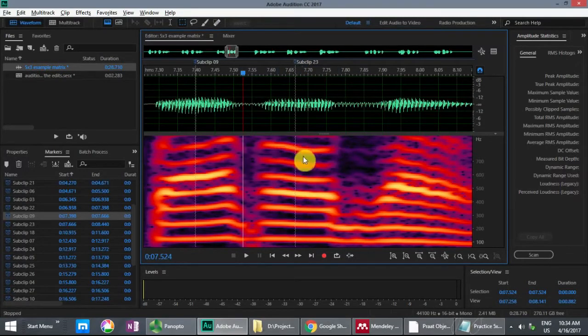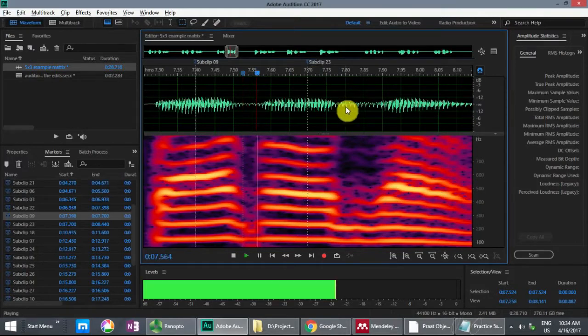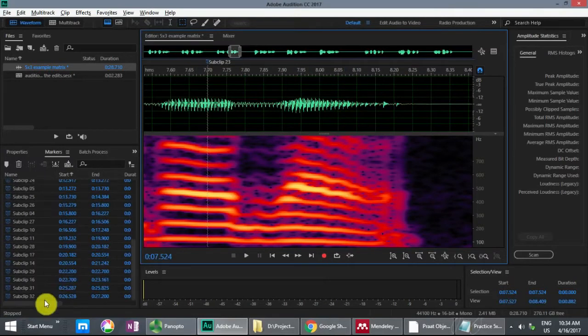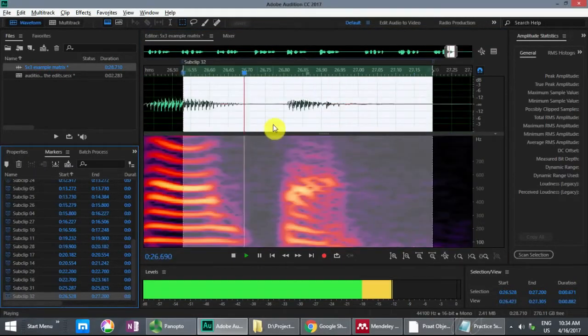So you see, we don't really see the U-shaped figure there because we're coming and going to different phonemes, but you can see a little bit of a dip, and I would say that it's a little bit earlier here. So we may want to move these over just a tad to make it match up better. Old rolls. Old fish.